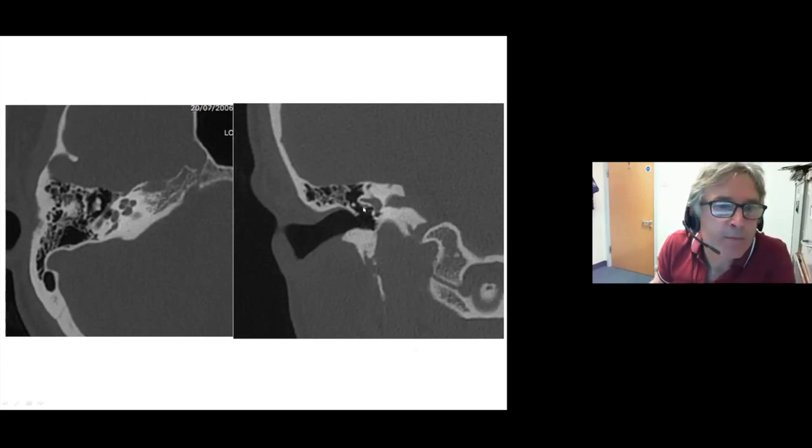So sometimes the bony margin of the facial nerve canal is dehiscent, and the nerve actually prolapses down. You can see a discrete soft tissue mass. It's relatively unusual, but you do see it sometimes, and it's an important anatomical variation to point out if you do see it.